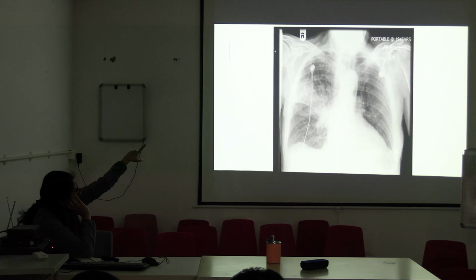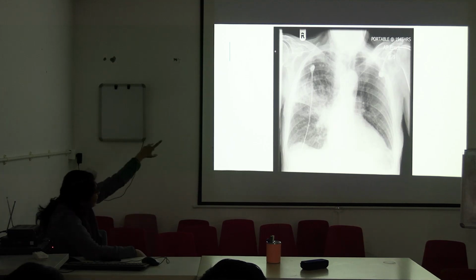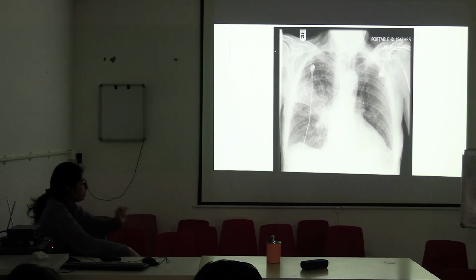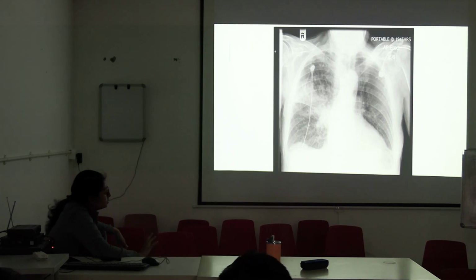না, এটাকে ওটা গ্রস রোটেশন ইউ ওন্ট কমেন্ট, ঠিক আছে, মোটামুটি নর্মাল বলতে পারো। আমি মানছি তোর পয়েন্টটা তুই ঠিক বলছিস যে এইদিকে ক্লাভিকেলের মিডিয়াল এন্ড থেকে হয়তো ডিস্টেন্সটা একটু পুরো ইকুয়াল হবে না, a little bit difference is there, ঠিক আছে। Then just talk about, then describe the domes of the diaphragm. Normal. Skin and subcutaneous tissue and bones, any abnormality? No abnormality. Describe what you are getting in the lung.